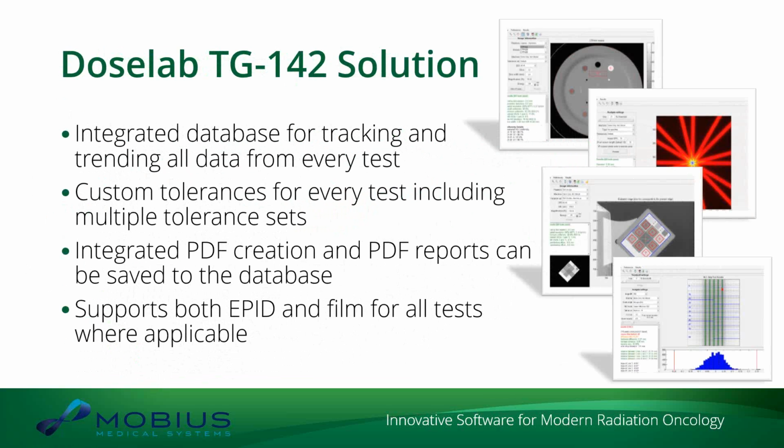There's an integrated database. It basically will track and trend all of your data for pretty much every test. And it allows you to create custom tolerances for basically every test and every different result in the tests. And you can even create multiple tolerance sets so that if you want to have one that is tighter tolerances, to really test things, but you're not going to actually use that for your TG-142, you can do that. You can do all kinds of different things there.